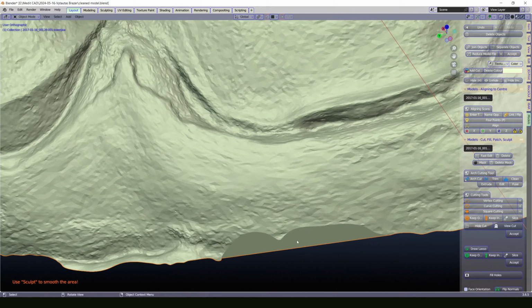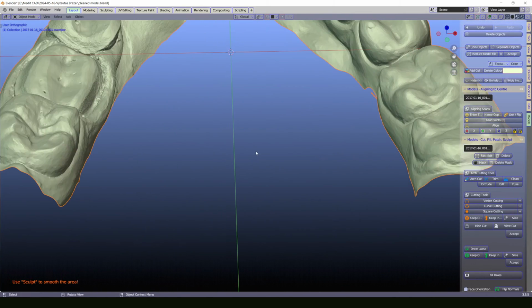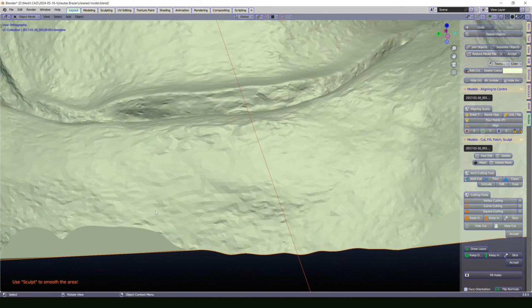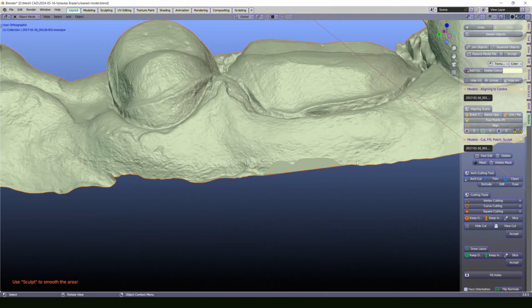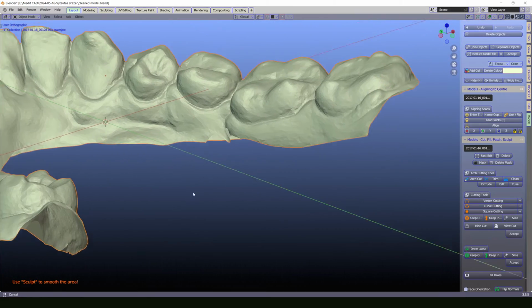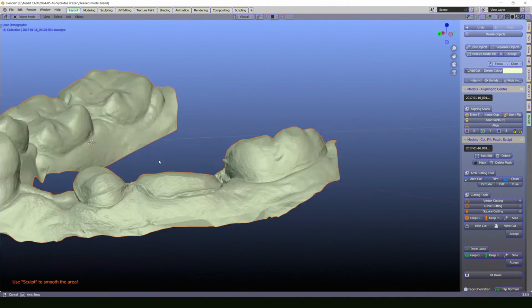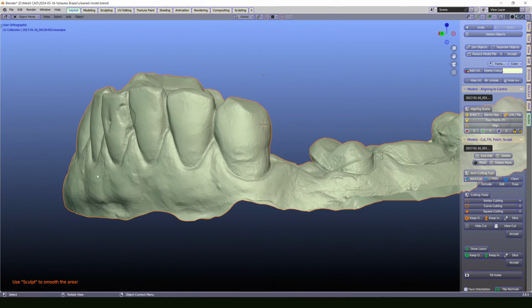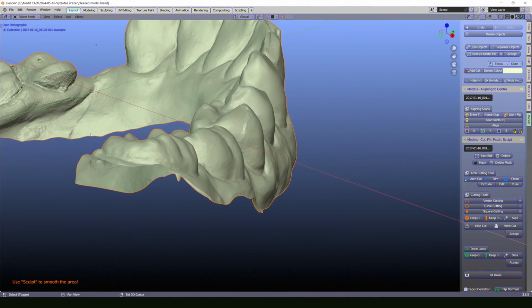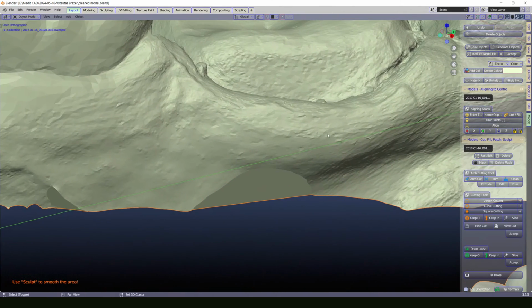But look at here now. Now that surface is very flat and it's very different. As you can see, now these closed spots, bridged ones, they are very flat and very geometric, looking like parametric design files. And if you would like, we can replicate the surface of our natural scan. And we can do it as following.